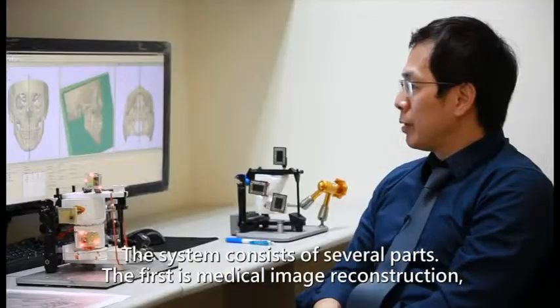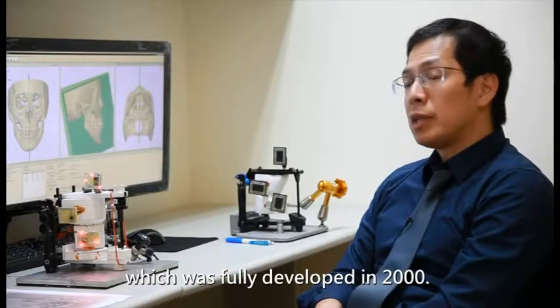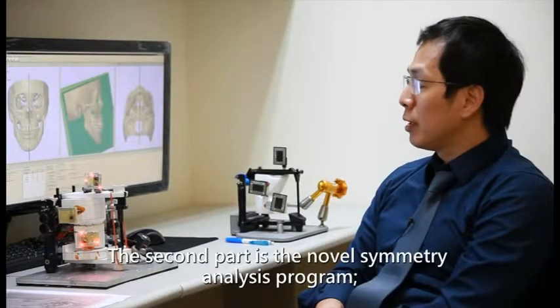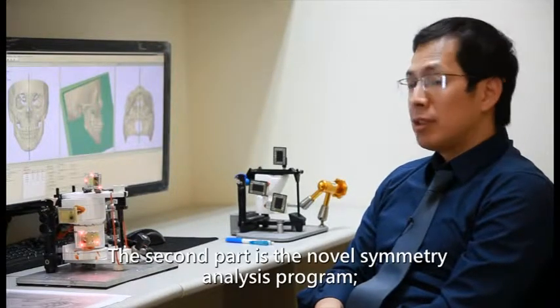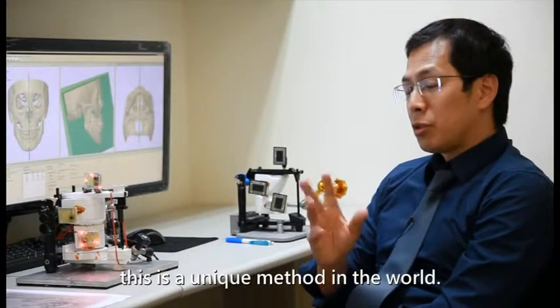The system consists of several parts. The first is medical image reconstruction, which was fully developed in 2000. The second part is the novel symmetry analysis program. This is a unique method in the world.